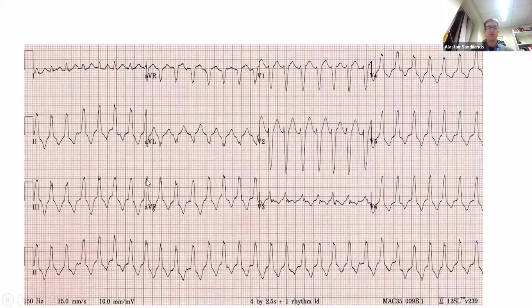So now we've got these broad beats where they all happen together. There are no sinus beats at all. They are all broad. Now we have to look at this, and it does remind me a little bit of left bundle branch block, because we've got this little R. But no, it isn't, because look at our axis. Our axis is very positive in inferior leads, so this suggests something coming from the top of the heart down.